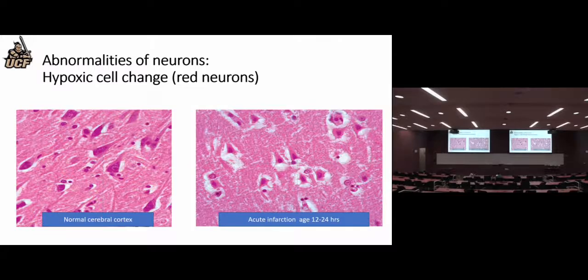And now here you can see sort of a difference. Dr. Hussein's thing. You can see these are sort of bigger. This is supposedly the same power, I guess. And you can see that white around them. The rim is much larger relative to the size of the neurons. And some of the neurons, I don't know if that's a neuron or some kind of an activated glial cell. It looks like it's got 2 nuclei. But if you stare at this enough, you can sort of see that this is the abnormal one and that's the normal one.